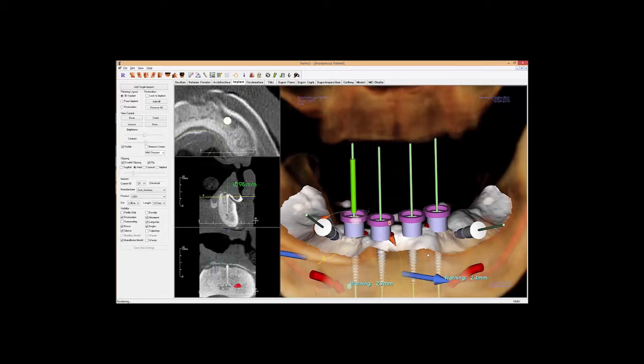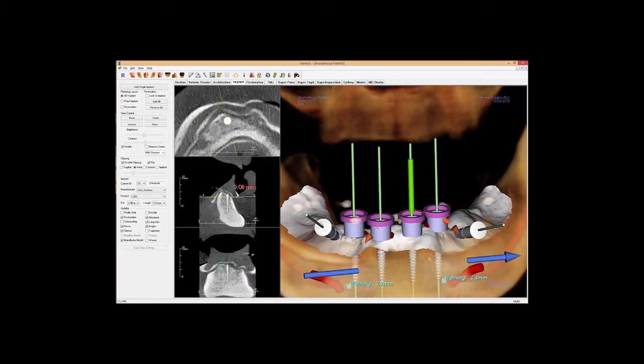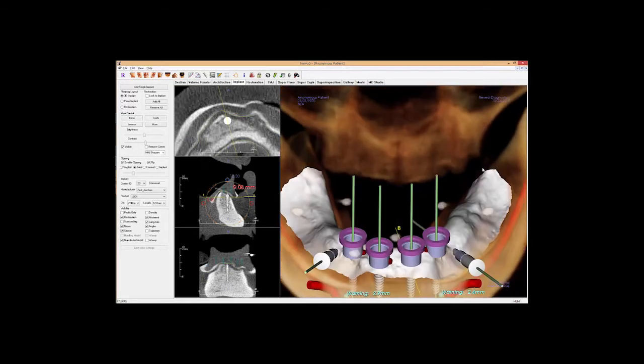with seating. If we're doing a tissue punch, for example, it's not going to be an issue when we seat that guide. On this one here with number 23, it looks like the sleeve might impact the bone, so we may need to pull it a little bit more towards the buccal and crestal here, just so that we can clear that space and they'll be able to fit that sleeve there. So a couple of considerations.